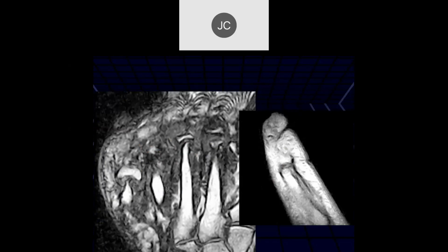Okay, and then here's more end-stage rheumatoid arthritis with a typical pencil and cup deformity that we were talking about last time, where you have synovial thickening and inflammatory disease, which erodes the subchondral bone on either side, leaving a little space where the bone is not yet eroded away. This is the pencil, and here's the cup, which is the phalangeal base.